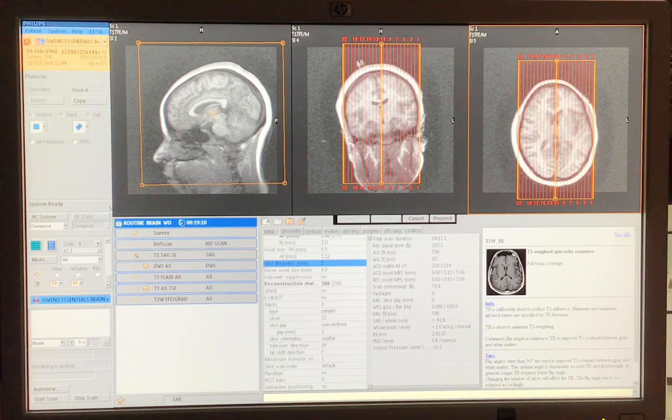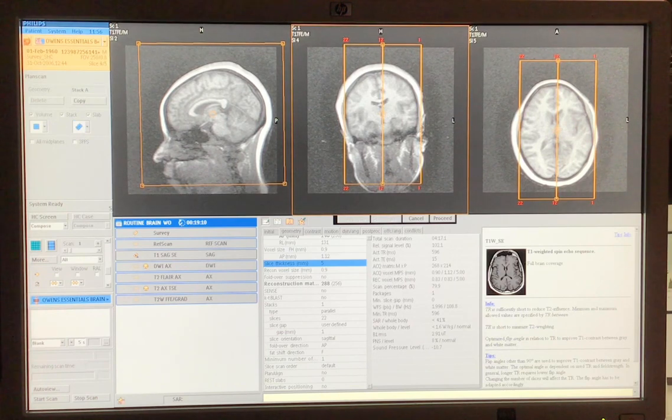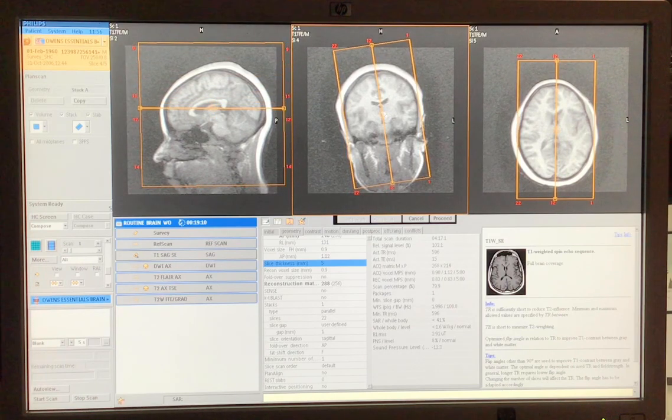If you do not want to see these red lines, I can turn them off. I can click on this and say, I only want to see the first slice, the middle slice, and the last slice. This is kind of nice to do, because now I can say, I need to angle and use almost your middle slice as a ruler.